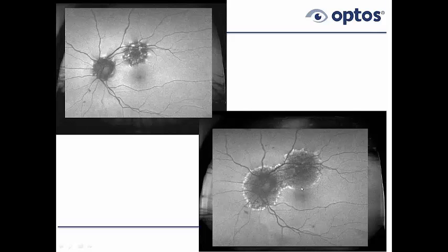The good news, if anything, is right over here closest to the fovea, there's not much going on. This doesn't really have a hyper autofluorescent band here, which is close to the fovea. So she has now been followed for about 8 months like this, and the good news is she's going into a stage where we don't think it's changing anymore. So it's becoming much less active at this point in time and didn't require treatment.